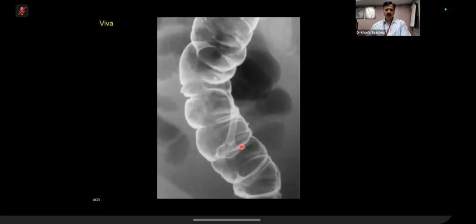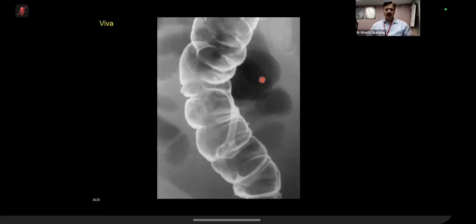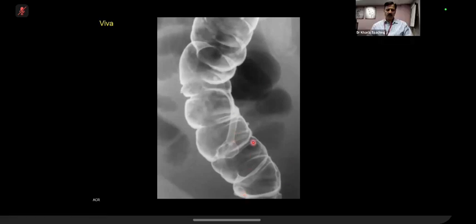Candidate 1, can you hear me? Yes, sir. Okay, we will crack on, and we have to go quite fast. I will ask you leading questions at times, and at times on some films I will take a more traditional viva. Right. What do you think is this where I'm pointing out? That's the polyp with the pedicle.